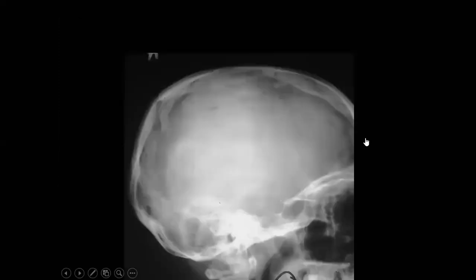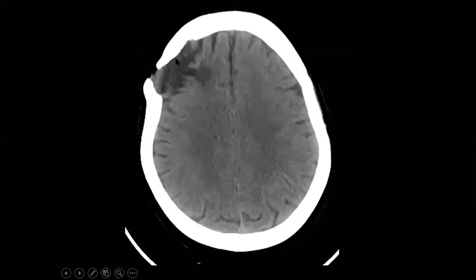Here it may be a tumor, but now I will ask about the history of this patient, if he has had anything like a previous fracture, right? So when you find either an operation or a fracture, you are going to check the CT, and when you find this CT appearance, this is what is called a leptomeningeal cyst or growing fracture. The name is a bit difficult, but when you find this appearance, they like it in spotting cases. So you should be aware of it.